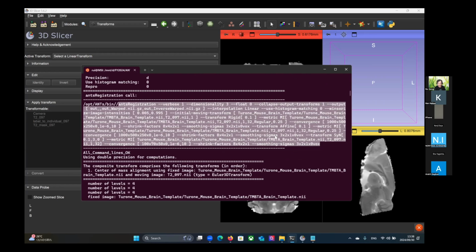But what each parameter means, you need to look them up because it's quite complicated. I see what you mean, but in that case, those are default parameters that were specified during the quick registration. Okay, this makes sense. So you could copy this, change some parameter and run, and then just iterate through a couple.